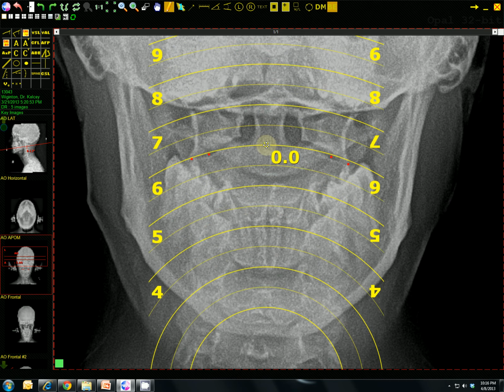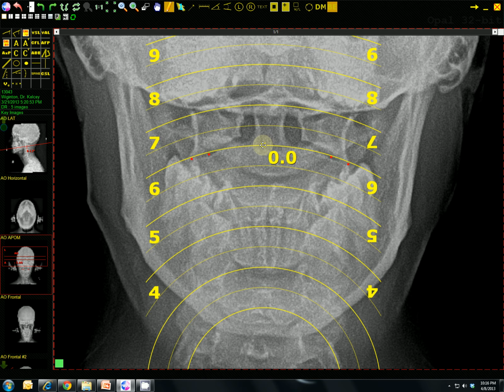The first thing we do is we don't want to superimpose on the buttons as much as possible. However, sometimes it's not always possible to do that. So the first thing we want to look at is lining up the outside edges first. So once those 2 are lined up, then I try and line up the 2 next ones and see if it's possible. It is pretty darn close. This superimposes just a little bit, but overall not too bad. We want to get, again, as close as possible.